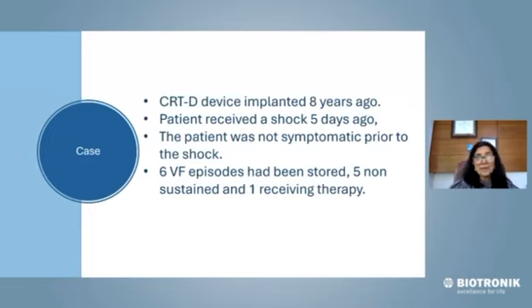The next case is a CRTD implanted 8 years ago. The patient received a shock 5 days ago. So that means he had a recent shock. The patient was not symptomatic prior to this shock. Now, this history is extremely important.